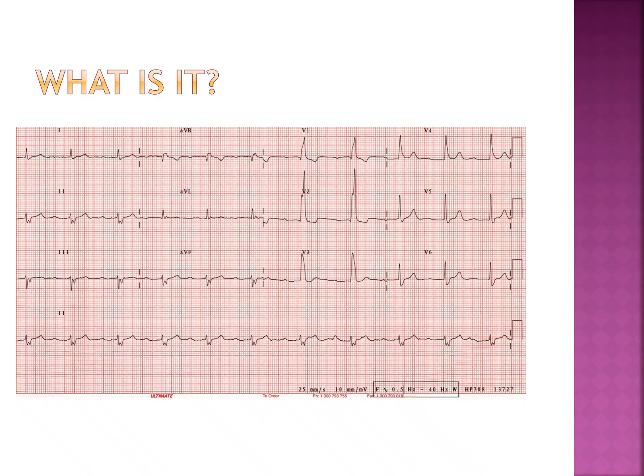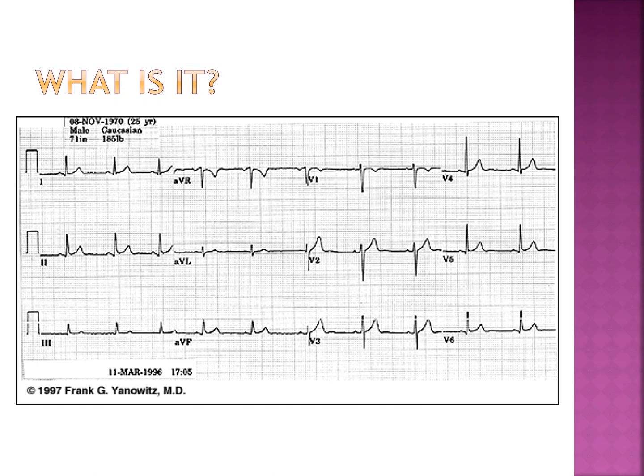So we'll call this a downward deflection. So AVF is down, so our right index finger is pointing down. Our left index finger is pointing up. So we have a left axis deviation. Were you right? Let's try again.